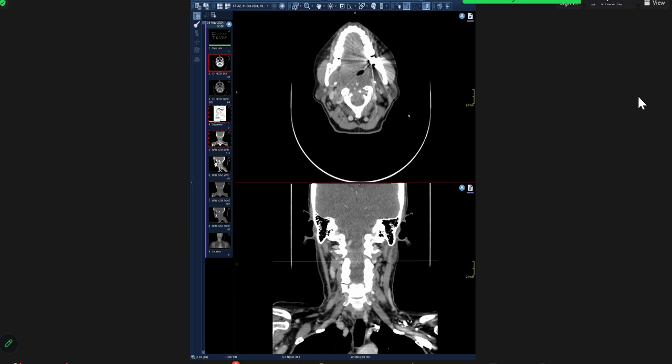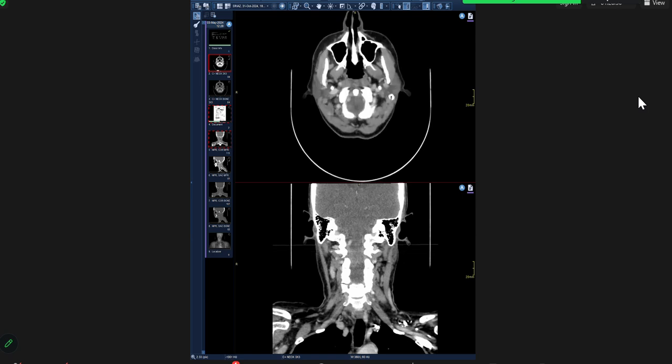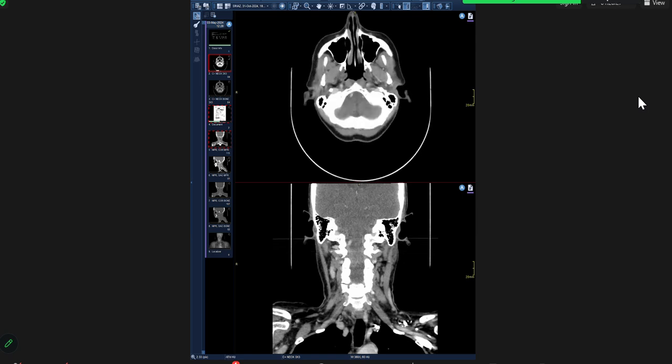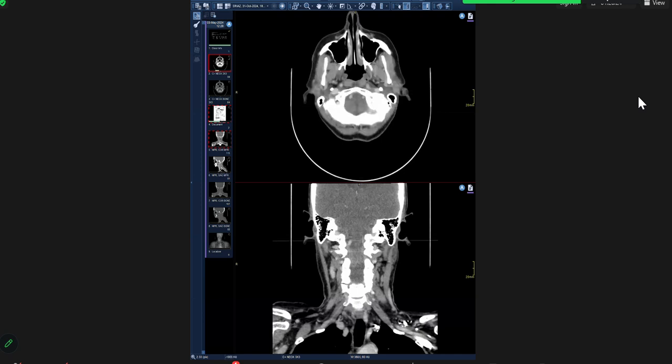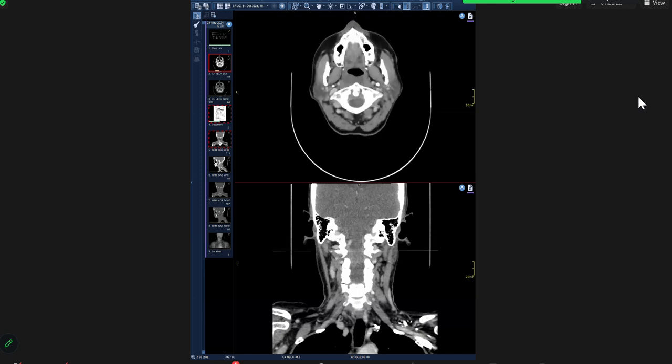Do you want to scroll through the images? I tried, but I'm unable to scroll, so I assume that they are not scrollable. No, no. Okay, so sorry. I can do that for you. Wherever you want me to stop, just tell me to stop.